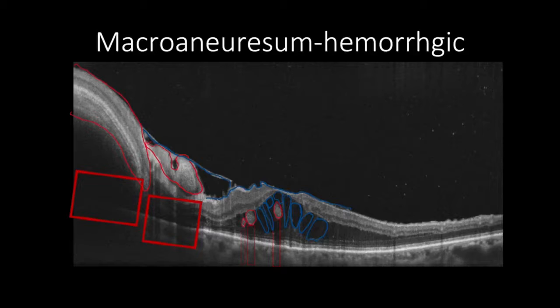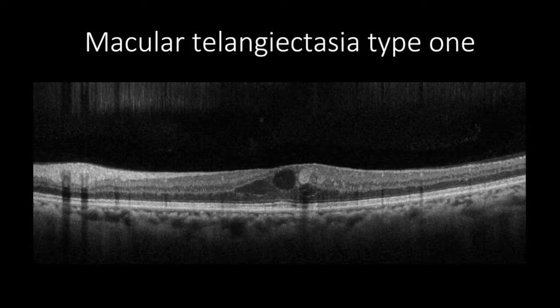OCT can be utilized to follow up macular changes in patients with arterial macroaneurysm. OCT may show macular edema improvement post-treatment or observation, which may help to follow up and treatment decision making.